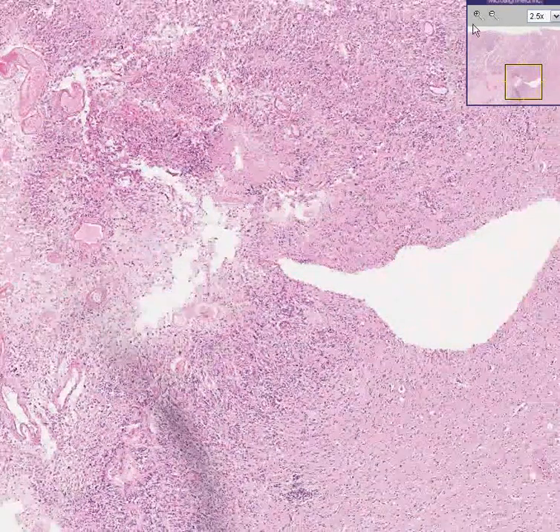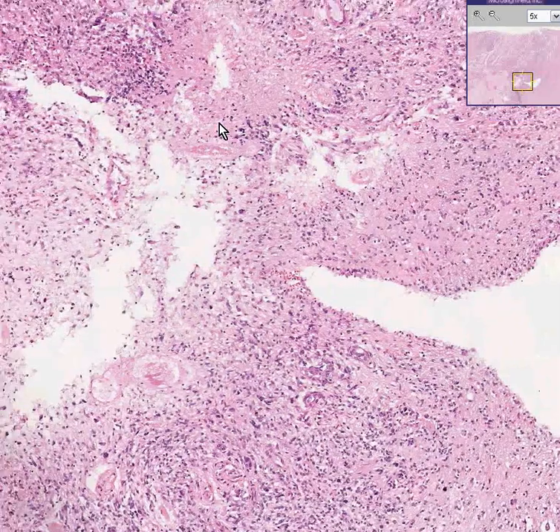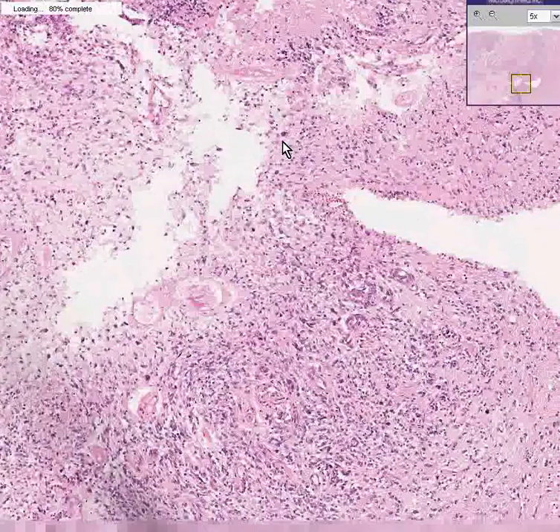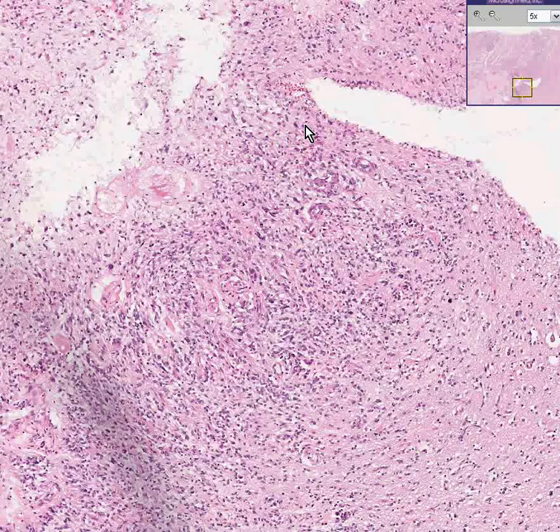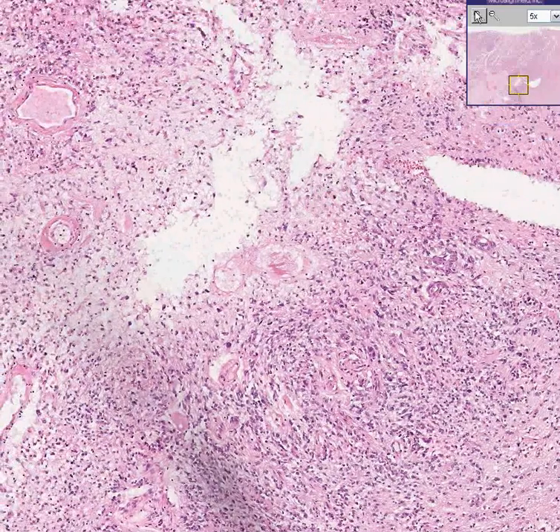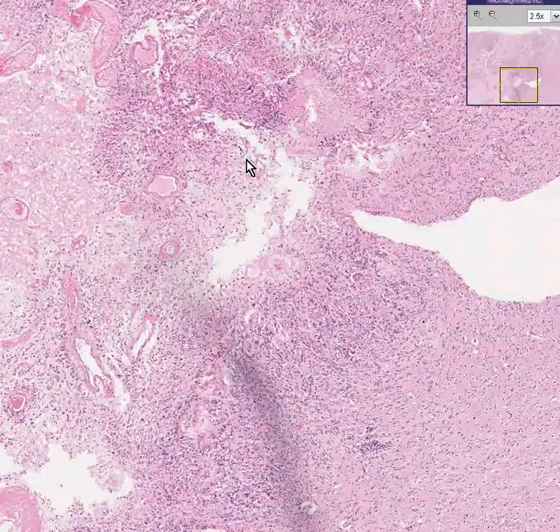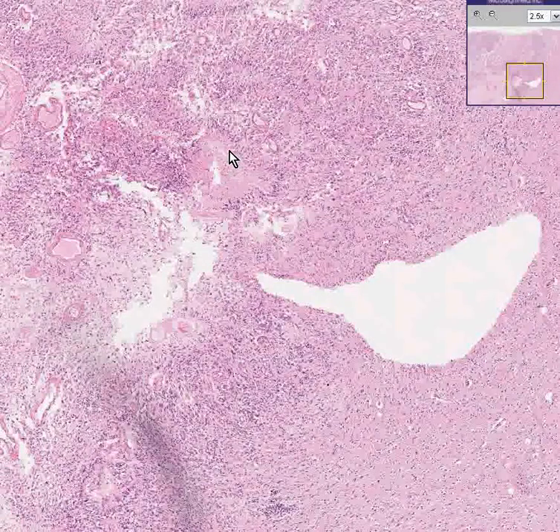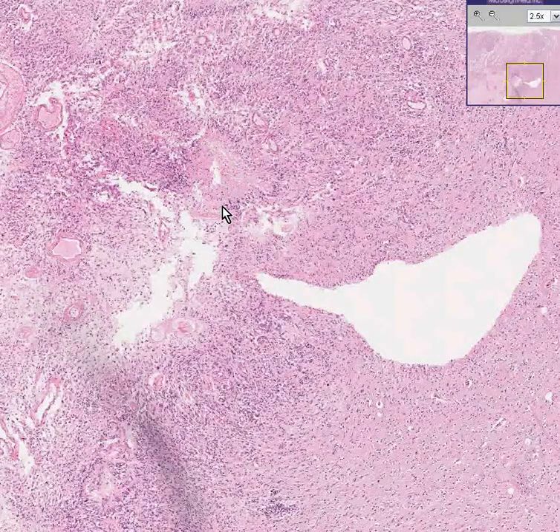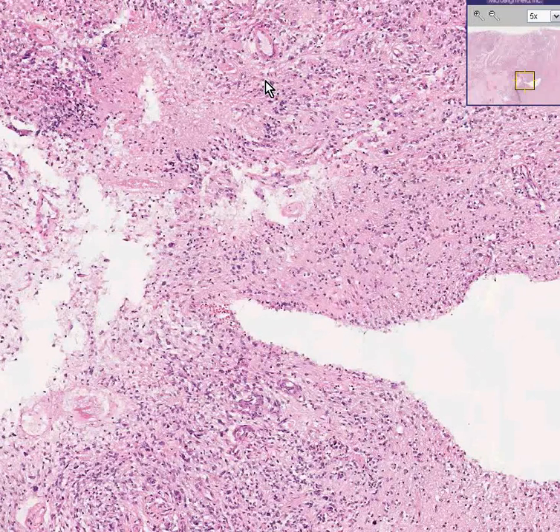And in addition, many of the tumor cells are arranged almost like a palisading feature around these blood vessels. Let me see if I can demonstrate that a little bit better. Here's a blood vessel. Here's a necrotic area around a blood vessel. But look how the cellular area seems to be lined up in a row, or palisading.